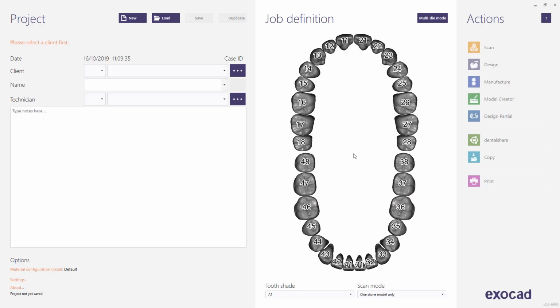This video tutorial from exocad will show all the features of the Smile Creator module. To begin, run the Dental DB application. The first step shows how to set up a case to be used with Smile Creator from the start. Note, there is a user guide indicating how to proceed.